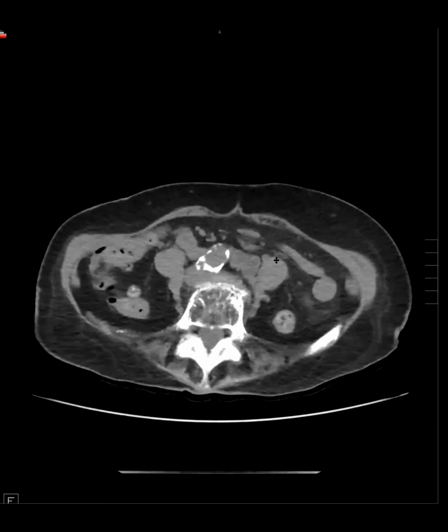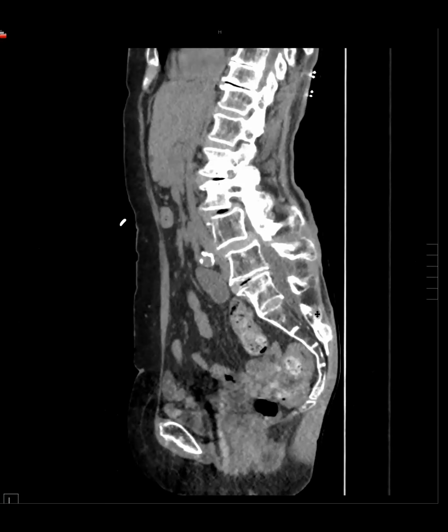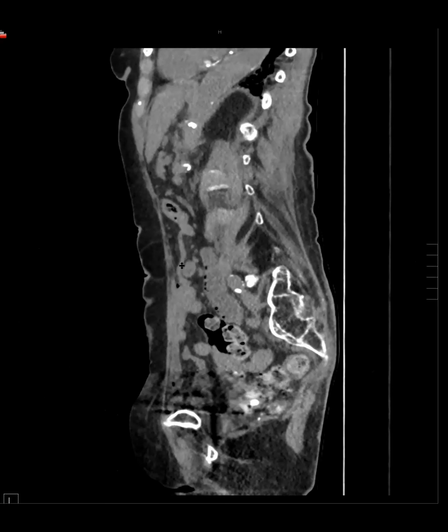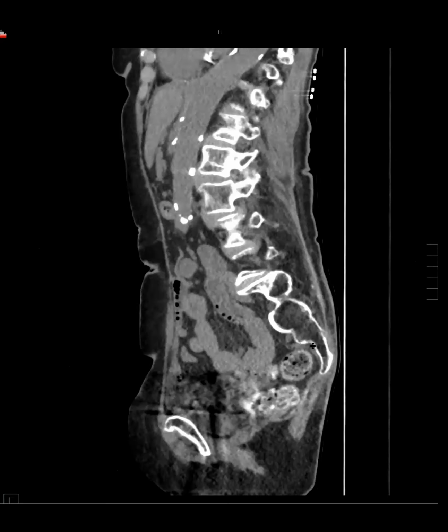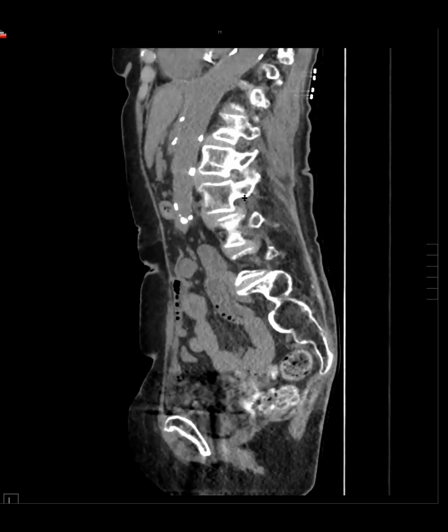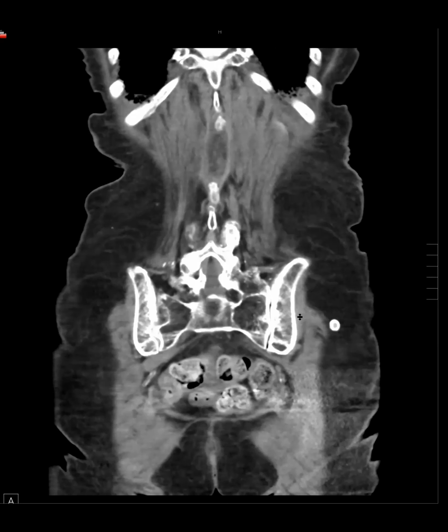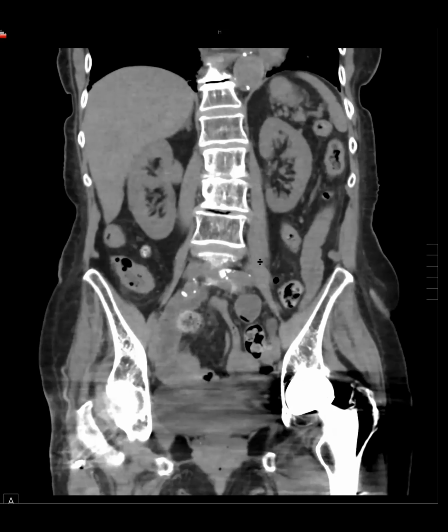Another thing that I've done recently is just add a mesenteric sweep into my search pattern, because at RSNA I saw a presentation about how we miss a lot of mesenteric nodal mets from neuroendocrine tumors. And it's usually on multiple exams by the time we catch it. But in retrospect, you can see it if you really look at the mesentery. So I've added an additional sweep through the whole mesentery. On this non-con it would be so hard, but on the post-contrast, I think it does pop out a little bit more. Oh yeah, for sure, I definitely agree. On the post, it's hard to miss.